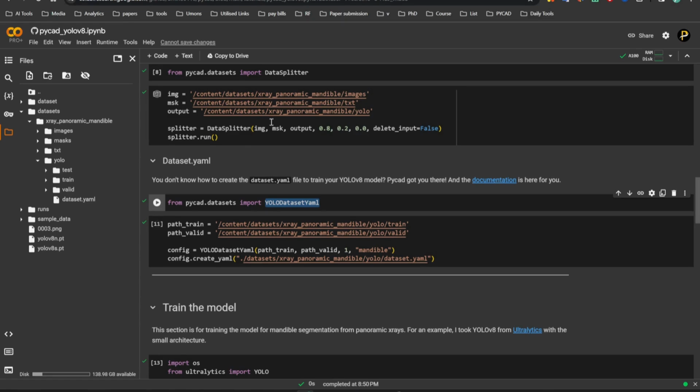But as I said, if you edit something somewhere here, for example, this will affect the other parts. So if you change something here, be careful to change these also, because sometimes it won't work because it's searching for a file in some specific directory. Then you need to update it also here.